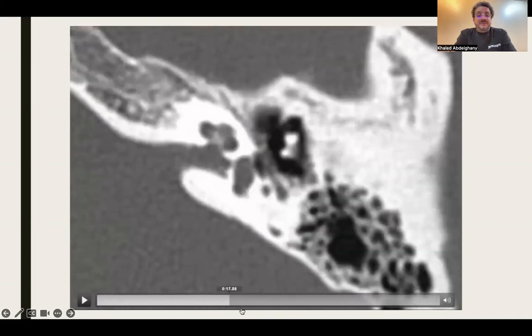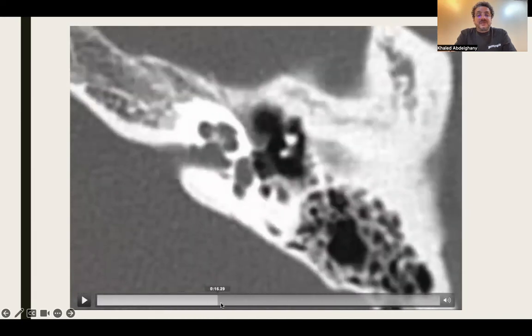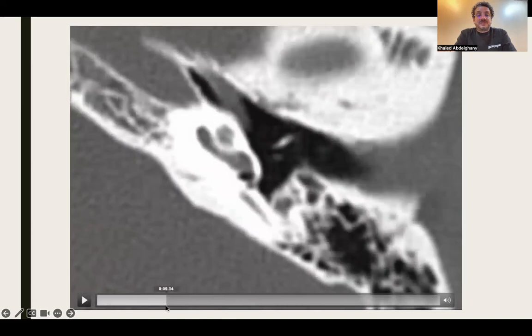which are very important for having the spiral shape, the spiral configuration of the cochlea, based on these two structures. The first structure is the interscalar septa. These are the bony septa separating the cochlear turns. Here we can see the bony septum separating the basal turn from the middle turn, and the bony septum separating the apical turn from the middle turn.